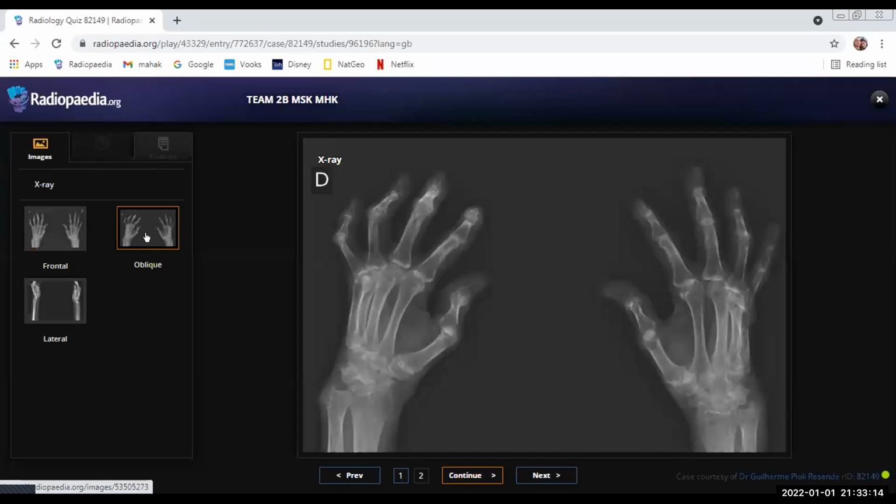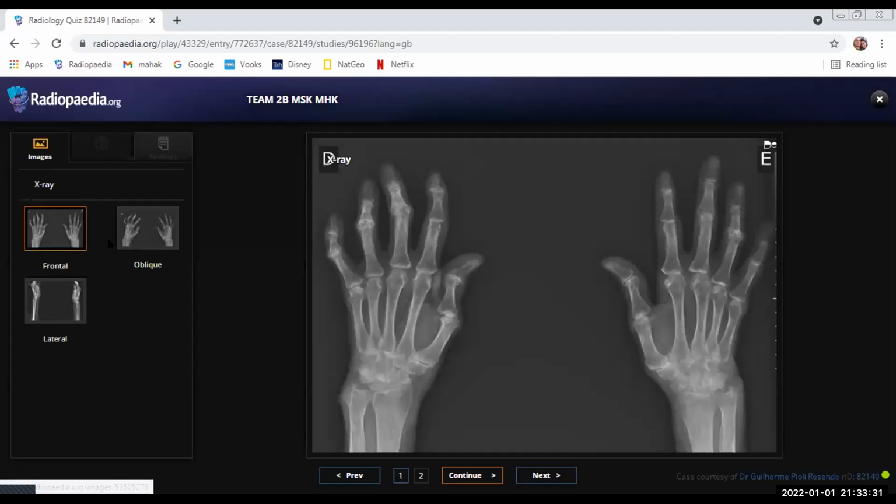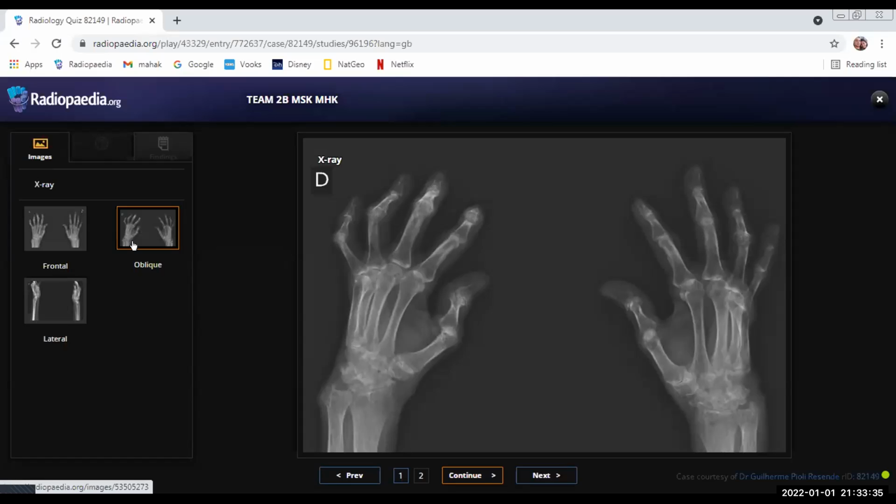Erosive osteoarthritis, yes, you are right. It would usually have a gull-wing appearance, which I can only see here, but I was considering it as a part of rheumatoid arthritis. But considering this joint involvement, yes, maybe erosive osteoarthritis could be put in the differential. Again, I would look at the rheumatoid factors and then reach a final diagnosis in this case.